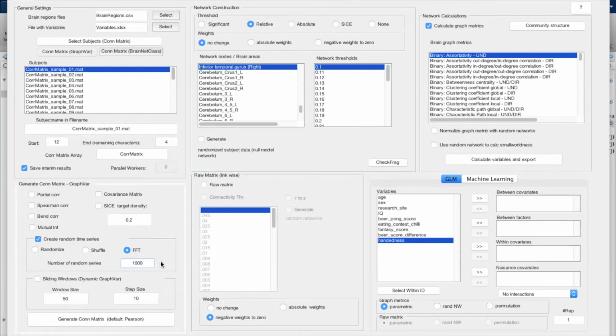And you can create random time series for building a null model distribution, which is then used, based on this random data, to determine the significance of the association between those two time series. And if you have this p-value, and I'm going to show you this a little bit later, you can use those for significance-based thresholding, building the connectivity matrix by using this non-parametrically derived significance value.